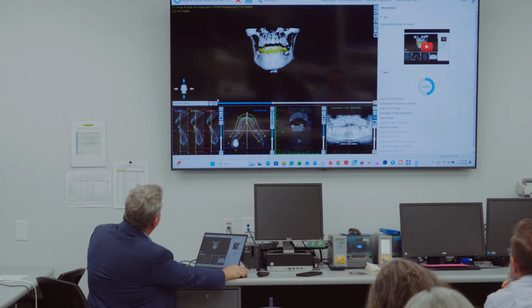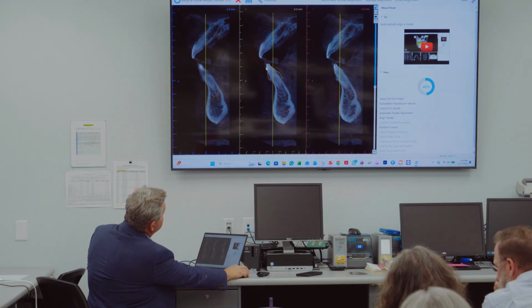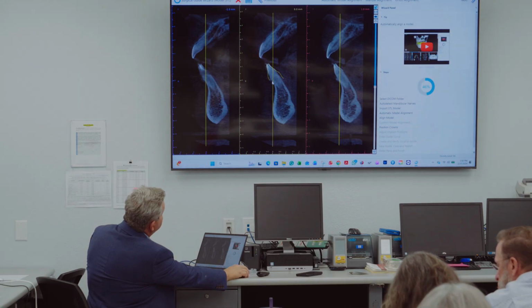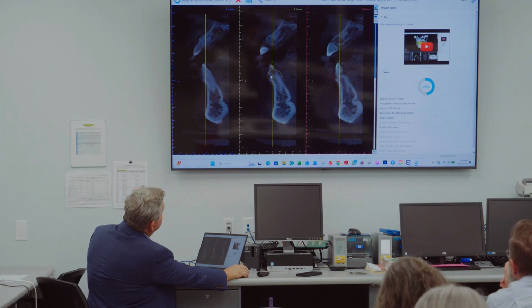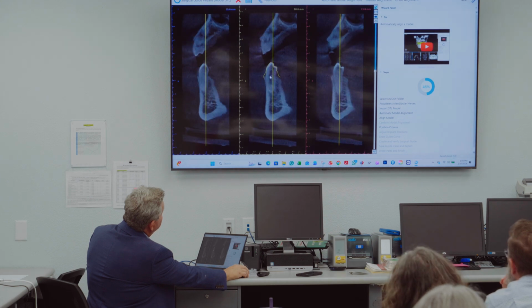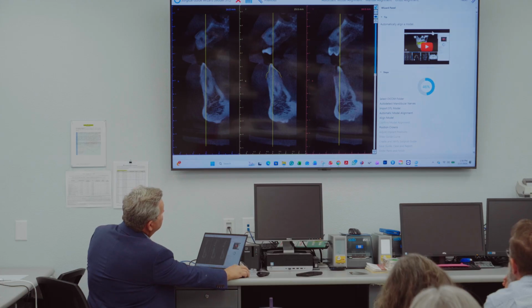You can look at it over here in this screen, and they'll actually show you the teeth. So this is the tooth of the model. You have soft tissue here, that's what the gap is. And you can scroll through that and see how that follows all the way through. That's right on, that's dead on. We like that, okay? 5 years ago we really couldn't do this. This is a cool technology, but it does all this automatedly.